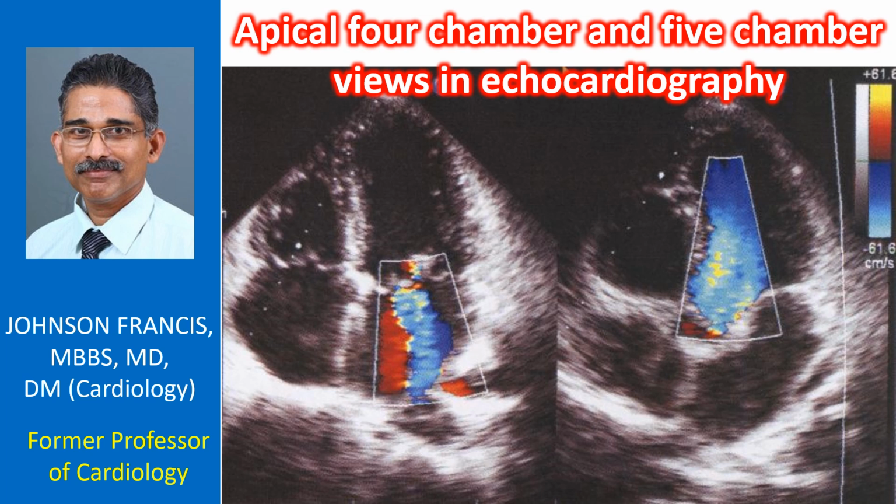Atrioventricular valve regurgitation and stenosis can be seen well in these views. Regurgitation jet gradients and slopes can be estimated from this view. Gradients in mitral and tricuspid stenosis are also estimated from the apical 4-chamber view. Inlet and muscular interventricular septum is visualized well in 4-chamber view.